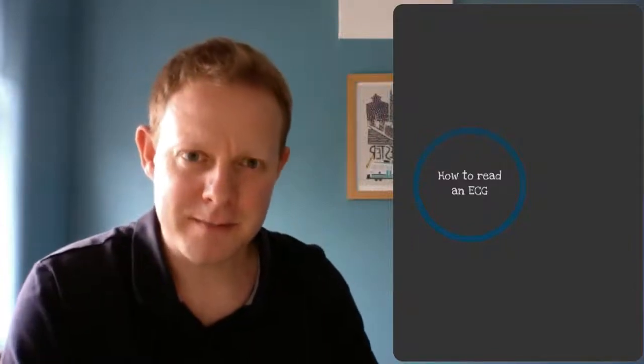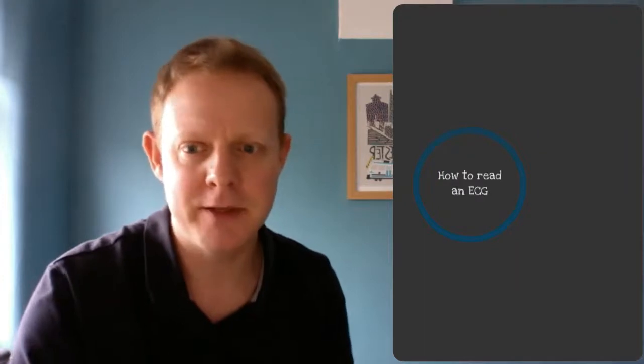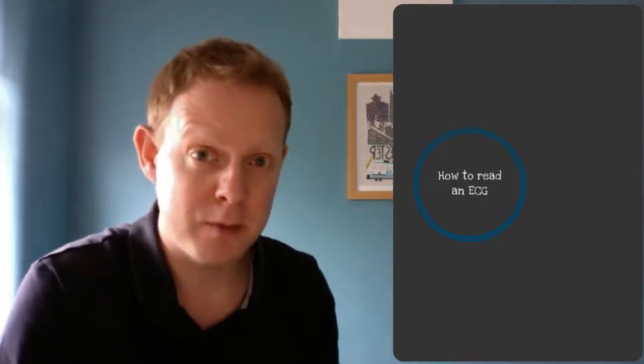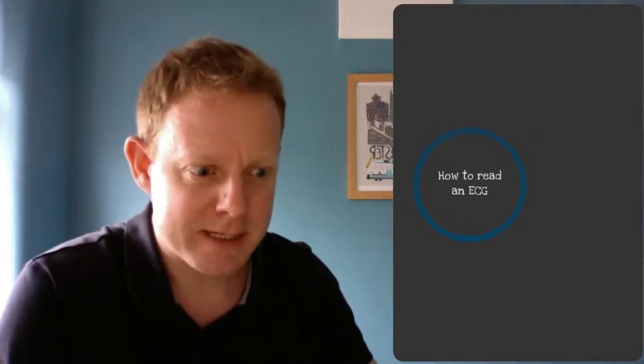Hello and welcome to my second ECG basics video. So in this one, we're going to talk about a system for reading an ECG, 6 simple steps to interpret a 12-lead ECG. And then I'm also going to talk about 6 simple steps within that to interpret your rhythm strip. So let's get started.